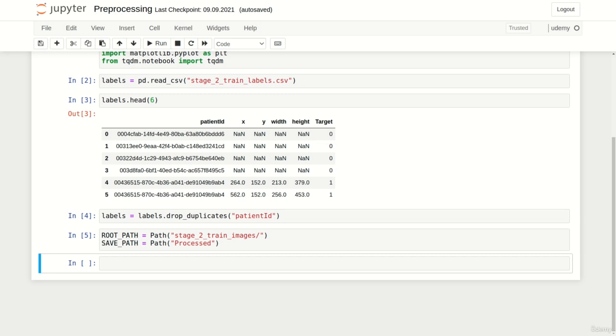Now it is time to look at some example images. To do so, we create a 3x3 subplot to visualize 9 X-ray images paired with their corresponding labels. At first we create the figure and axis objects and then use plt.subplots again.